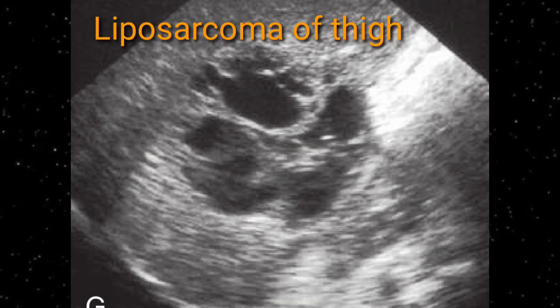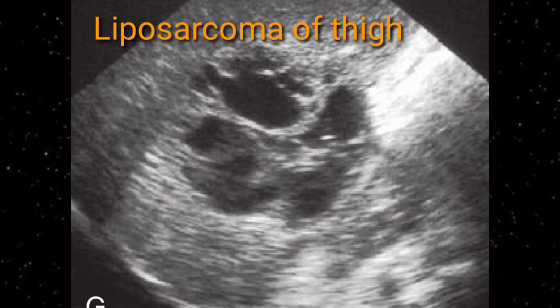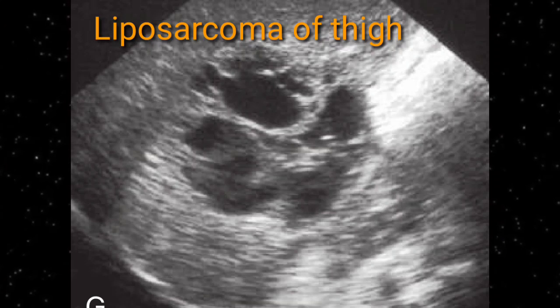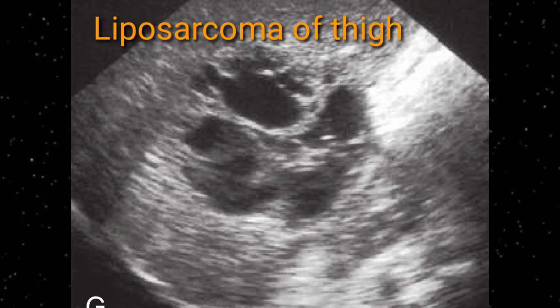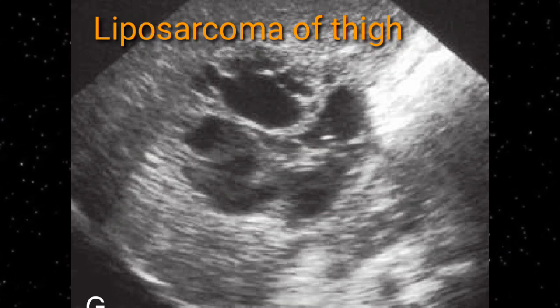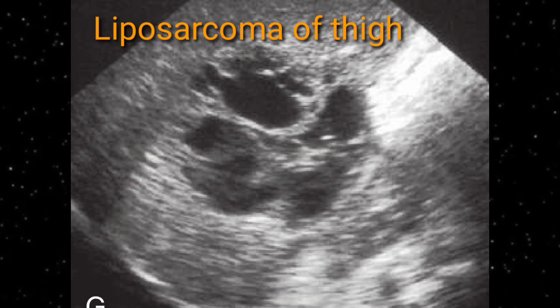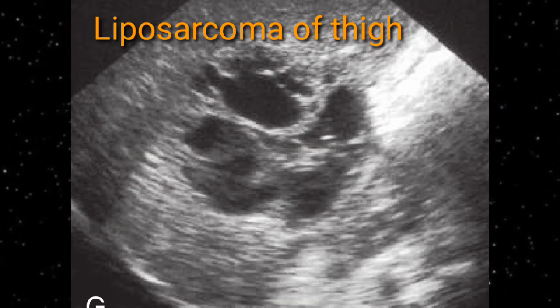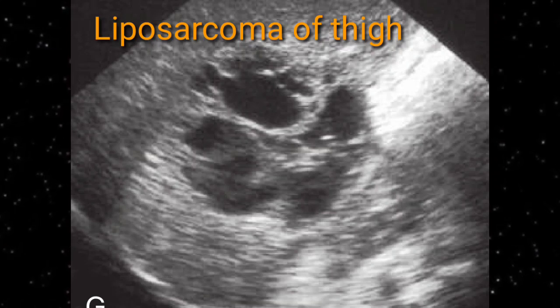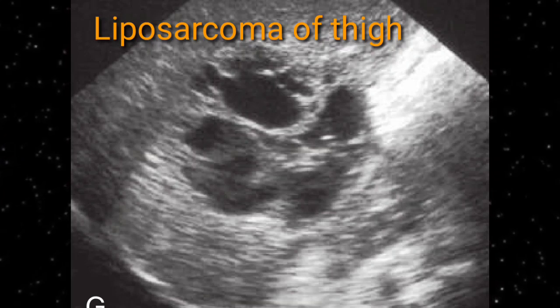Lipoma is very common and involves almost all parts and areas of the body, mainly where adipose tissue is abundant. But care must be taken if you see any degenerative changes or hypervascularity within the irregular fatty tumor. You must suspect malignancy. Liposarcoma causes liver mets, which are usually cystic, and you have already appreciated this cystic lesion within the liver, which is actually a cystic metastatic deposit.